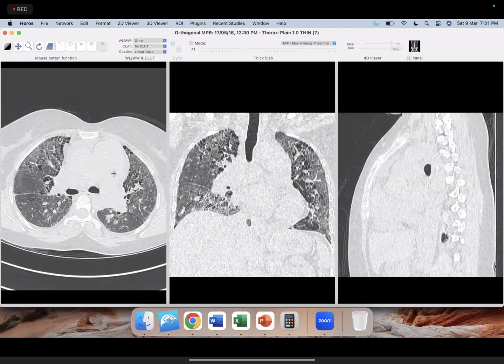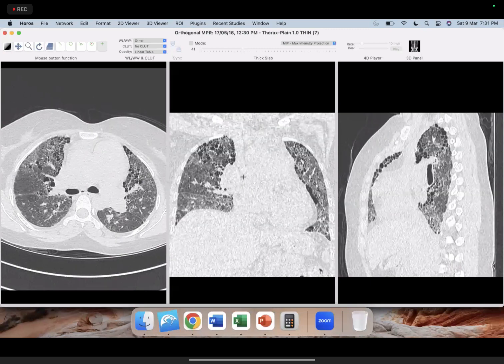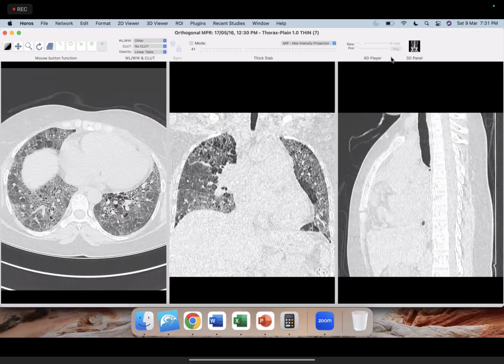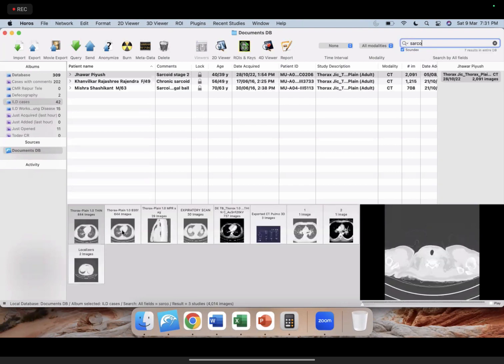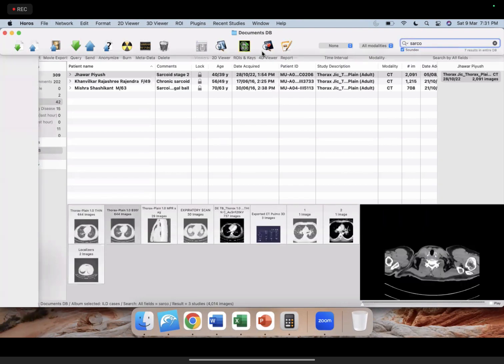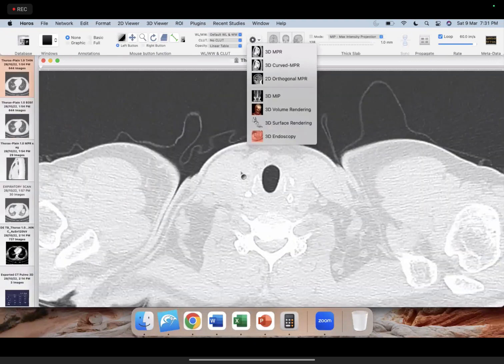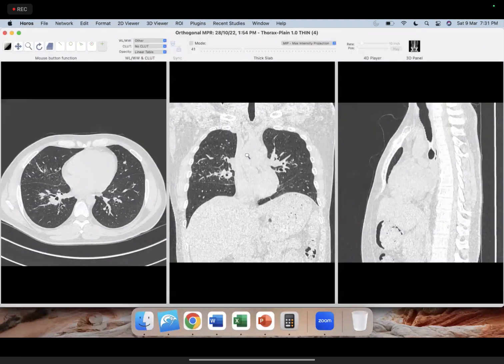But as long as the diagnosis goes, they are interested in knowing only whether the fibrosing or non-fibrotic form of HP is present. So this is the typical example for this. Then we can even look at a number of these cases also. These are very typical ones. So first we'll take a look at the lung window only. For this type of cases, the history is not important actually, so I'll skip it.